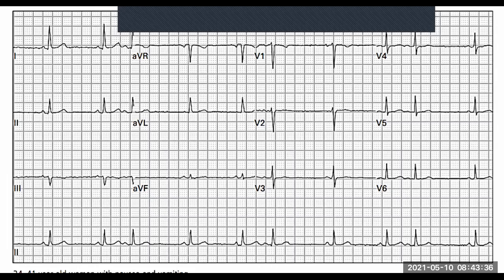Hey, very good. Well done. The exams will be a breeze if you can diagnose that as a student. I didn't even know how to pronounce atrium as a student. There you go. Premature atrial contractions. All right. Now, the reason why I picked this one is because it's always one that people get worried about, and they start diagnosing some weird things when it comes to premature atrial contractions.